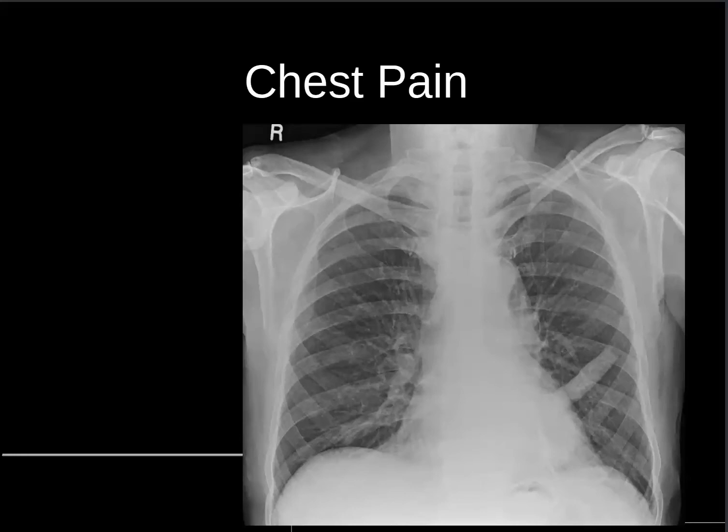Why does it look so conspicuous? Because it's dense and it's expanded. What causes rib density? Sclerotic metastases. This is a sclerotic metastasis of a left rib causing left-sided chest pain.